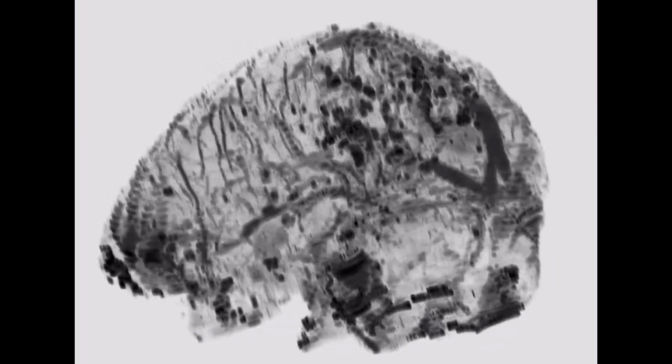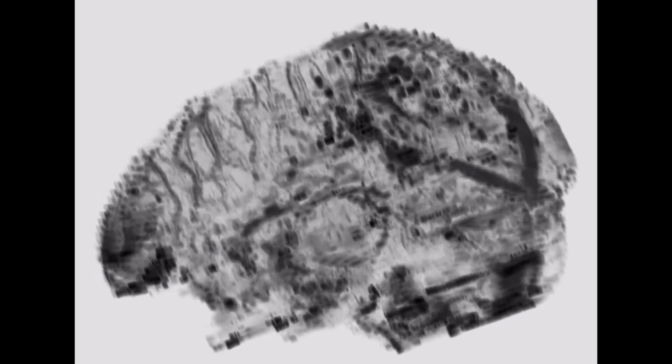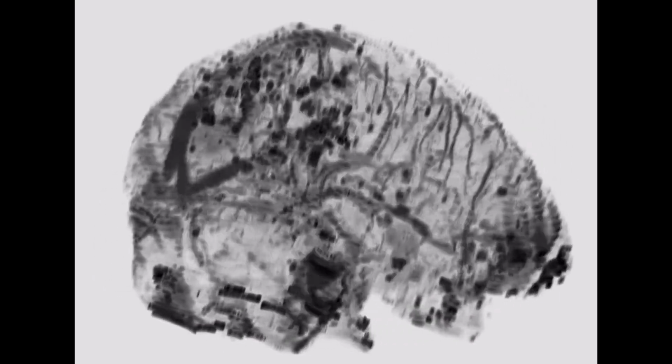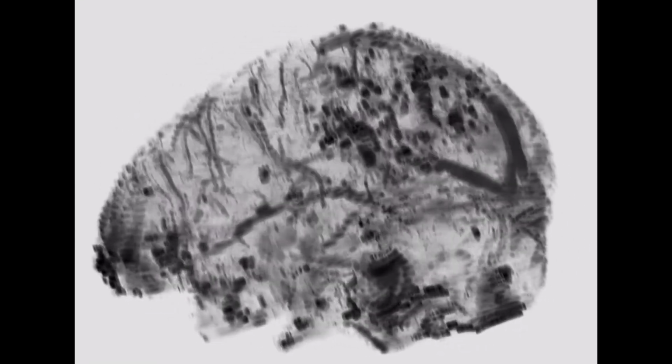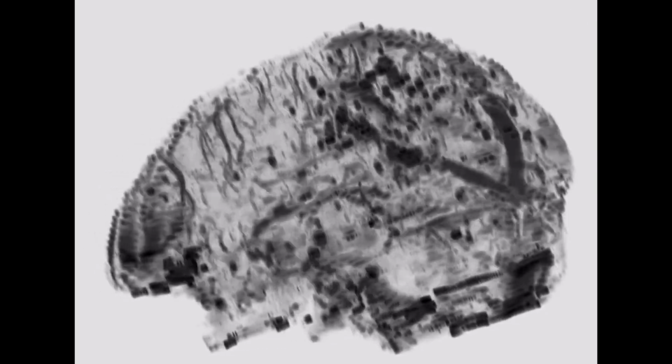This is an example of a 3D movie using this SWIM technology that shows you all the microbleeds embedded in the brain, and you can see the major veins that are surrounding this. So it gives you a nice perspective in 3 dimensions of how significant the damage was throughout the brain.